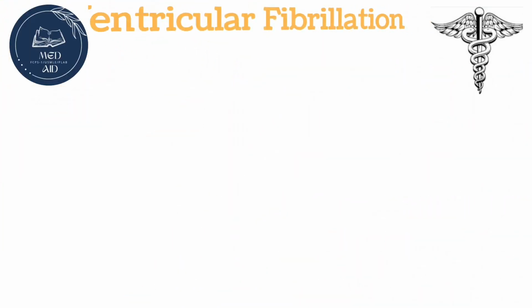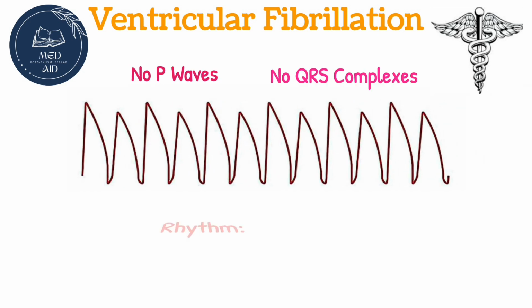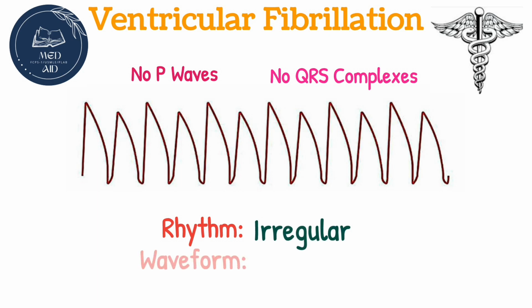Now we will discuss ventricular fibrillation. This is the ECG. It is a completely irregular rhythm with no identifiable waves. It is a fatal arrhythmia.